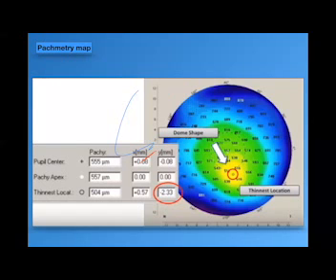As shown in this figure, the apex is 557 and the thinnest location is 504. The difference is too high, more than 50 micrometer between the apex and the thinnest location. This cornea is highly suspicious. And also the deviation here, marked by the red oval, the Y coordinate is more than -1.